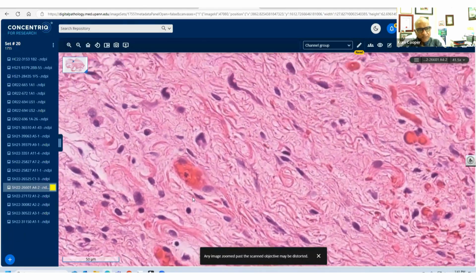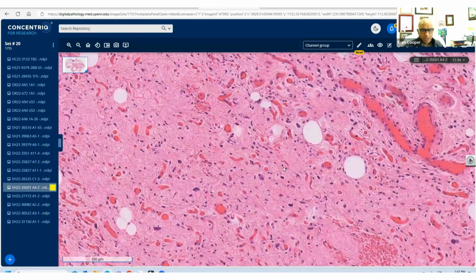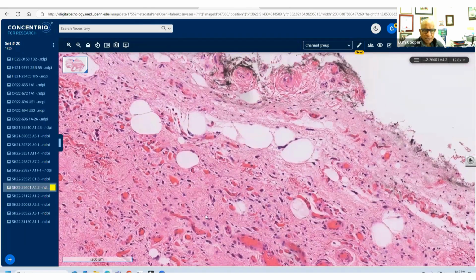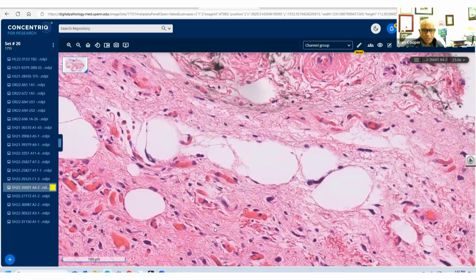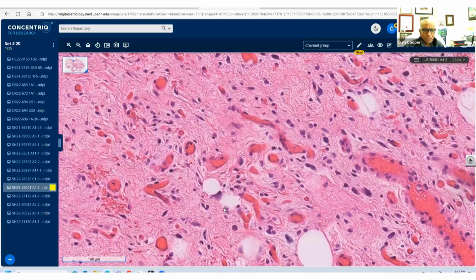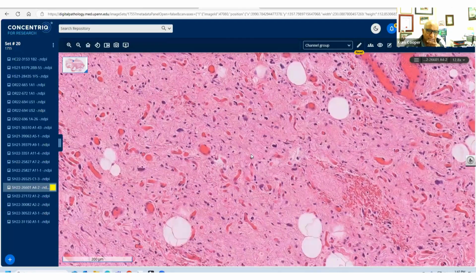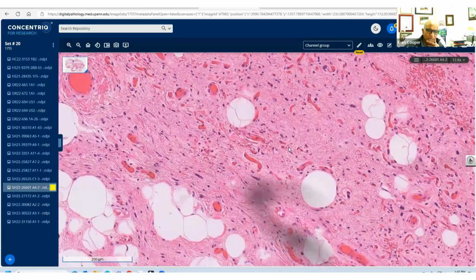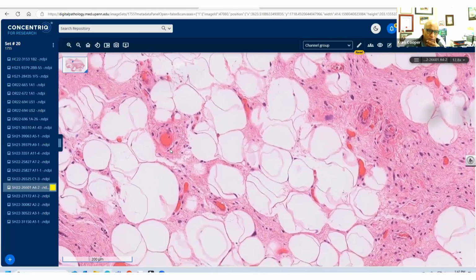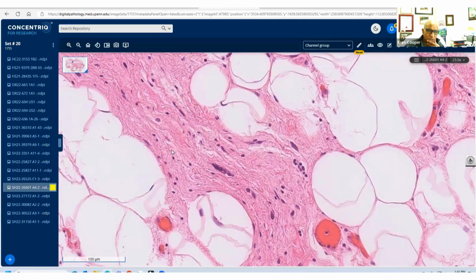Okay, here we go. There's some fat cells that have these hyperchromatic large cells. They're these spindled atypical cells in this sort of sclerotic background, and there's atypia in the fat cells as well. So you don't need lipoblasts. You don't have to find lipoblasts. Just the atypia alone is enough for the diagnosis. Now, the interesting aspect, if you don't know the concepts, would be that if this was in the extremity, if this was in the thigh or calf or arm, we would call this an ALT, atypical lipomatous tumor.